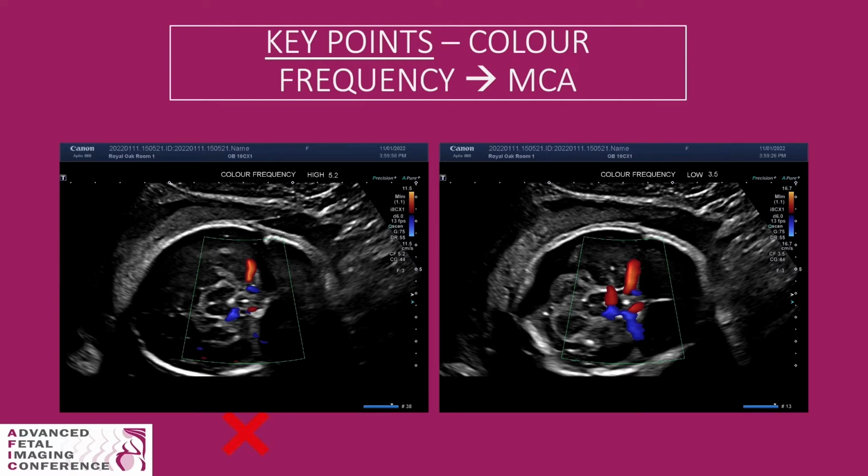in your daily practice. Again, if you all take nothing out of this presentation other than one concept, please let it be this. Color frequency is your new best friend and will make you look like a pro time and time and time again.